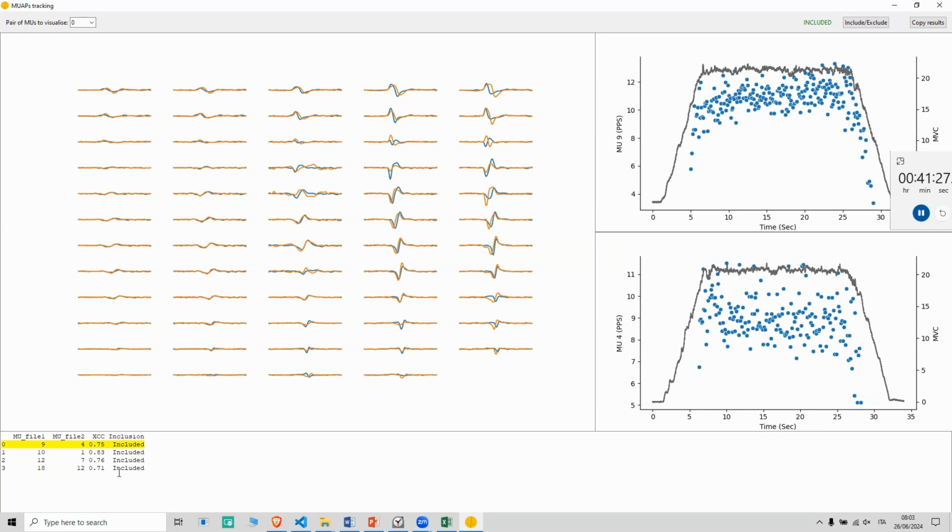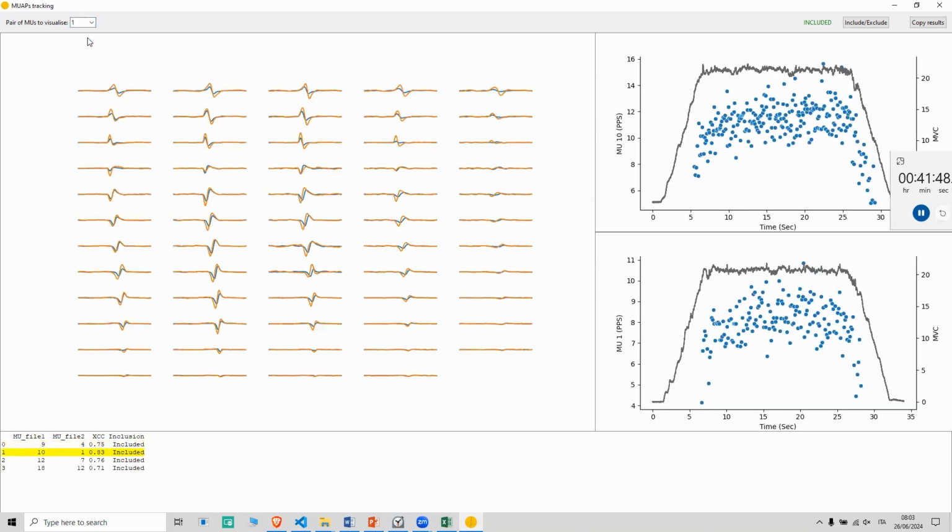But sometimes when you have a matching that you're not very confident about, or somewhat borderline, it's better to discard, okay? And try to always use matchings that are higher than 0.8. So for example, now I'll go to the matching that is 0.8, which is this next one, and look at both the template and also the firing properties. And now you can clearly see.